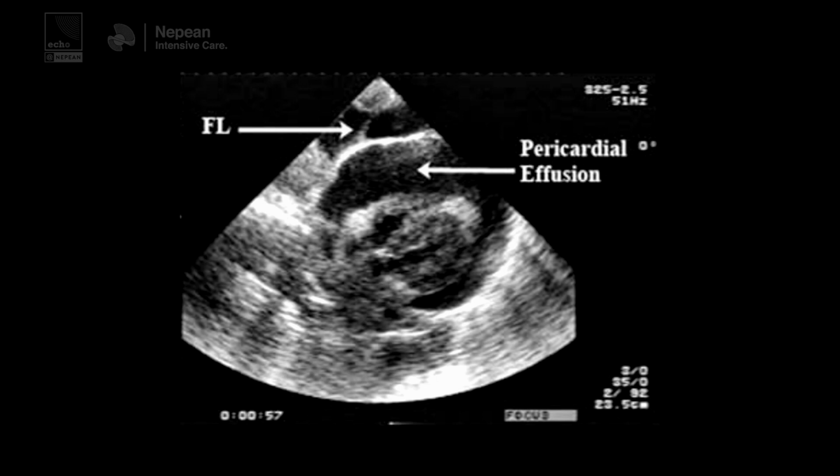This is commonly from a subcostal window, where you can see the two of them. And this is an example that we've shamelessly stolen from the internet. It's sad because we have got a lot of these, but we just haven't had a chance to save them. But you see this a lot. And it's really important to recognise, because you don't want to be over-calling pericardial effusions when the patient's just got ascites.